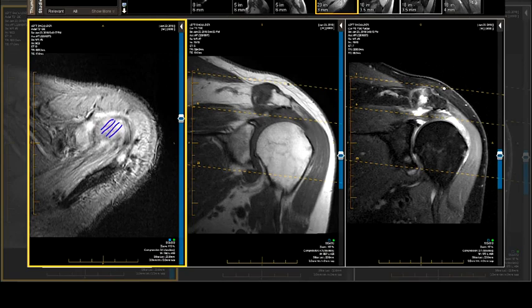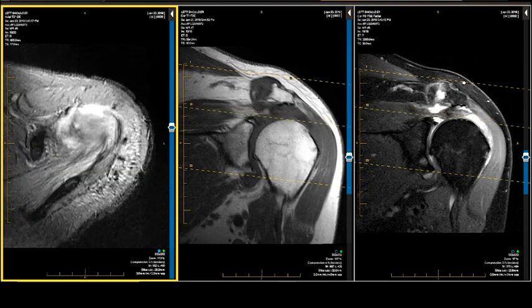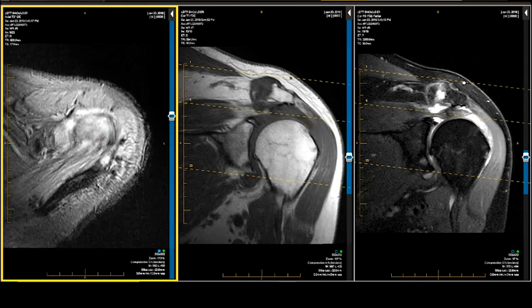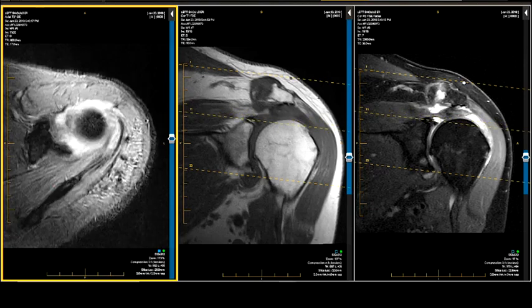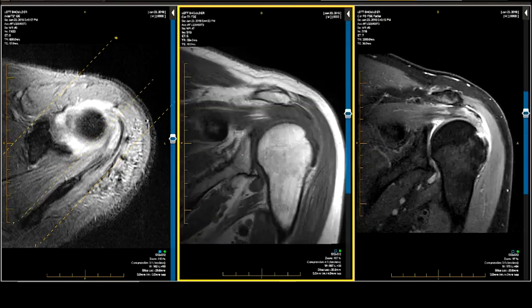We see some gray to white tissue. Here are some reasonable fibers in the back. Let's work our way down. So it looks like the humeral head may be bald. We're also noticing the massive muscular atrophy in the back. That's either edema or atrophy. If it's atrophy, we've got a problem. Let's go back there.